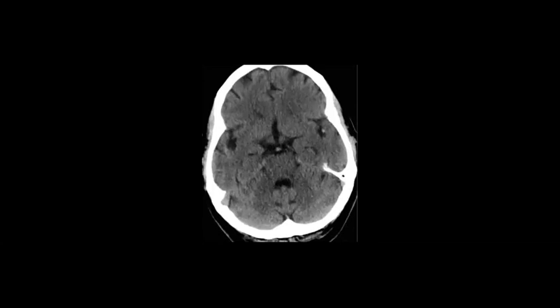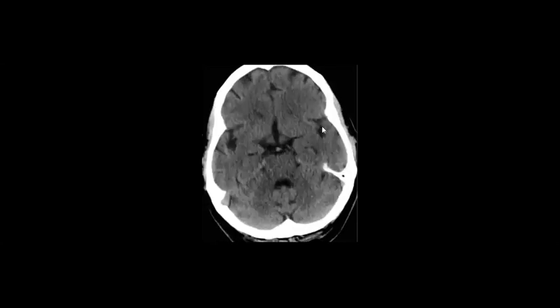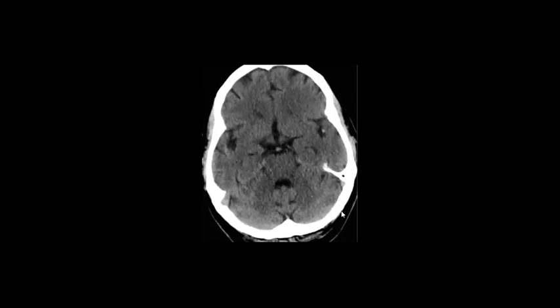Yeah, perfect. Ala. Left hyperdense MCA sign. If you compare it with other vessels, you will find it left dense. Until now, there is no infarction, but it is a hyperdense MCA sign. It's a very dangerous sign for infarction. Let's show you this case also.